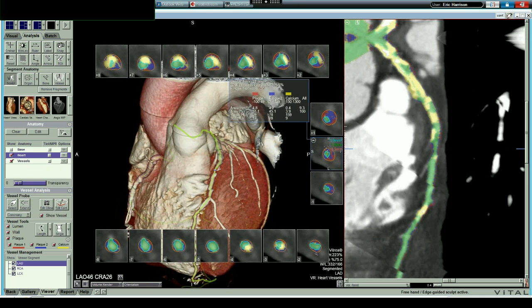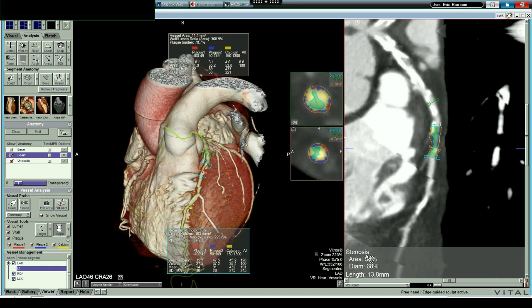It is sort of reticulated, doesn't relate to be in one lipid lake, but it's reticulated, and you can see the diameter of this vessel and how much smaller it is, and we can measure that over here and give you some parameters that will be particularly useful. And so let's go across here, and here we are. And so the diameter is 68% narrowing of that vessel right there.